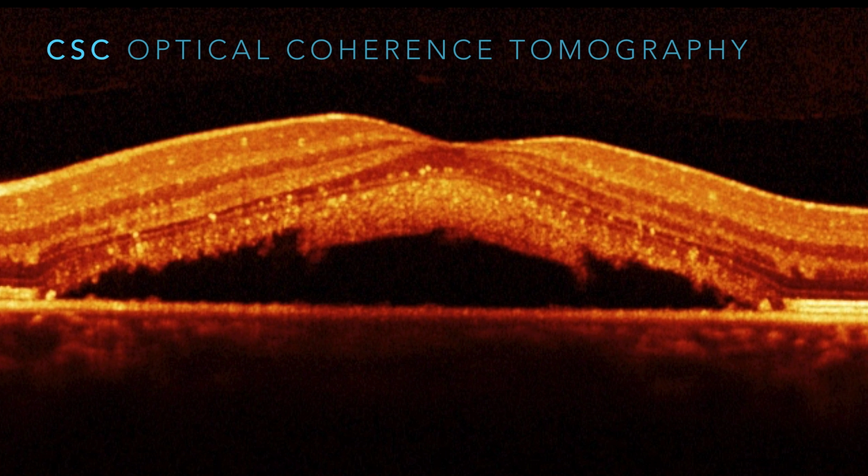Here's a little bit of a review of anatomy, but also specific to central serous. These little green dots that I put along that line represent an anatomical boundary that's not normally seen, and I'll tell you what that is in just a moment. As I go through these different lines, I want you to play along with me and say to yourself what each line is as a review.